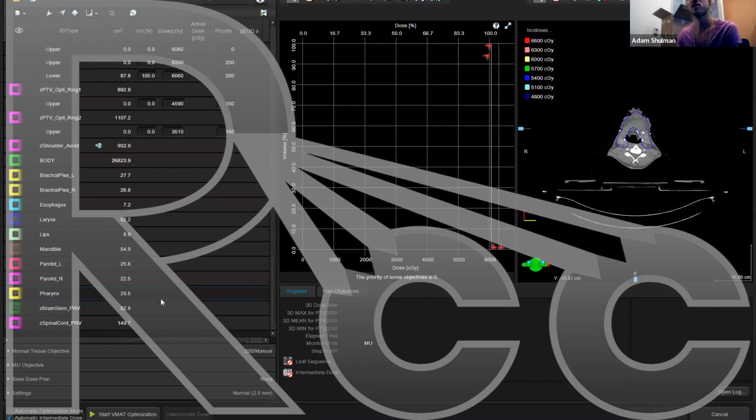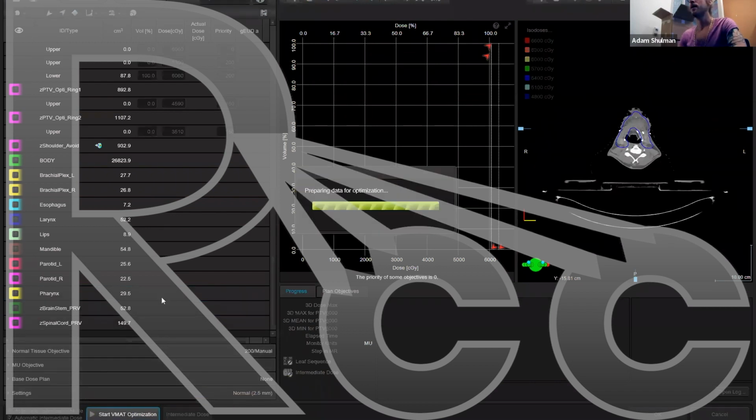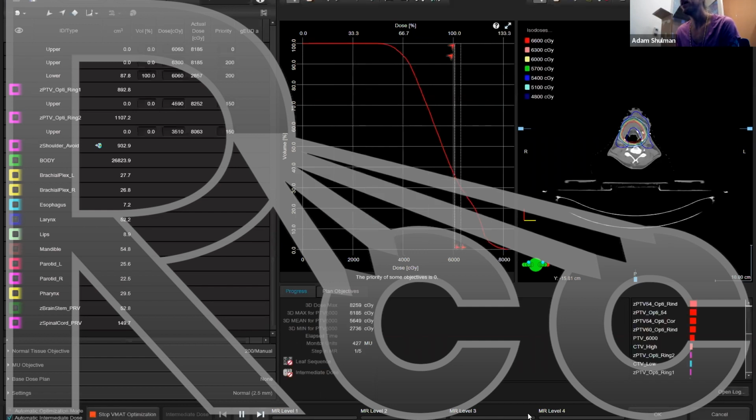So I'm going to go ahead and start the optimization. And again, Eclipse looks a little bit different. Don't get too stuck on what it looks like in Eclipse if you don't have Eclipse. The idea in Eclipse is these different MR levels. These are different complexities, basically, of the MLC leaves. So it starts off at the lowest complexity and increases.